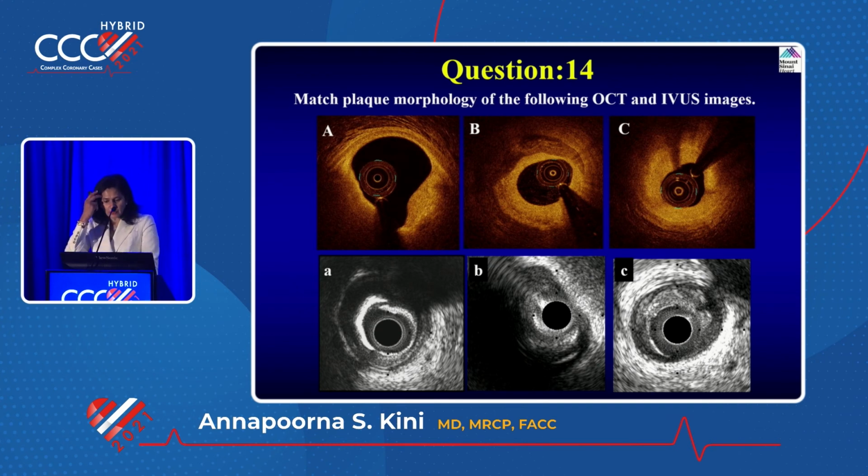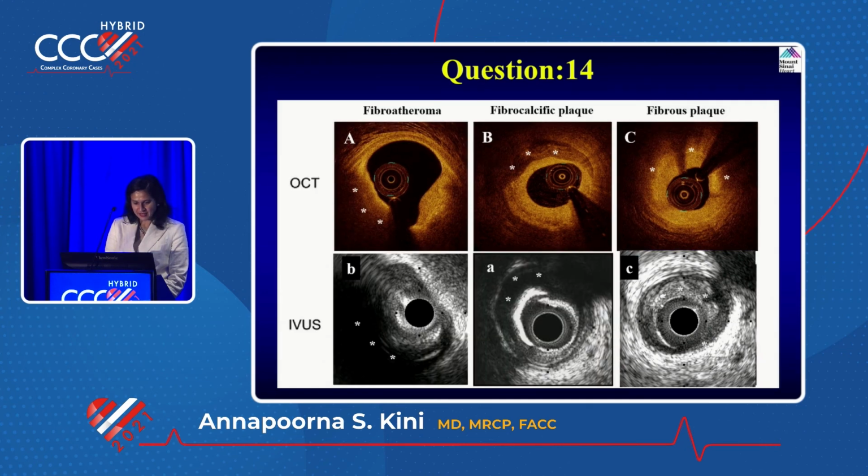Match OCT and IVUS. A goes with what? C? C, B with A, IVUS, right? B with A, IVUS. And C with C? Yeah. So A with B, B with A, and C with C.